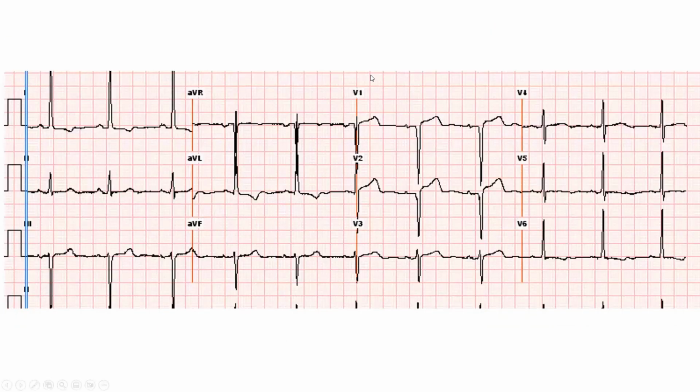I'll move to a simpler diagnosis. What does this patient have? And here I want you to recognize what the LVH voltage criteria are. The point of this EKG is that I see a lot of fellows not knowing the voltage criteria of LVH. You absolutely need to know the voltage criteria of LVH. There are 37 criteria. You need to know at least the 5 most common ones. And that EKG has a lot of them.